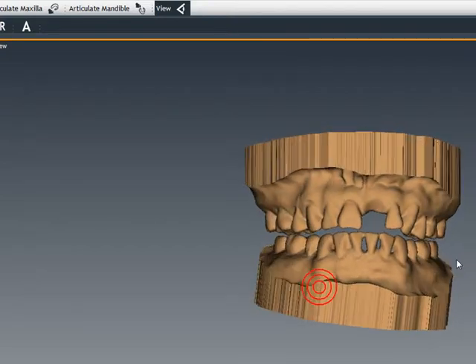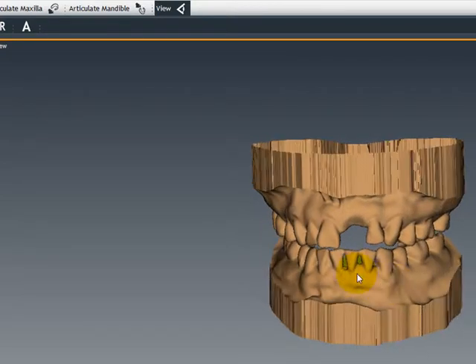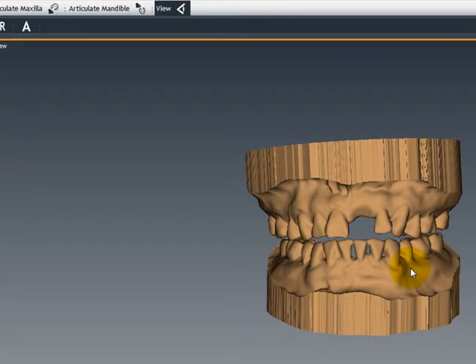So please make sure that when you take a bite next time, the patient is biting in centric occlusion so we can evaluate the interarch distance a little bit better. So moving forward, I will proceed to the segmentation process.